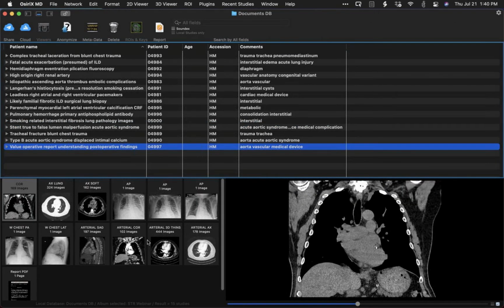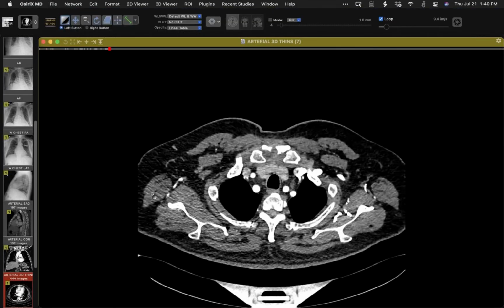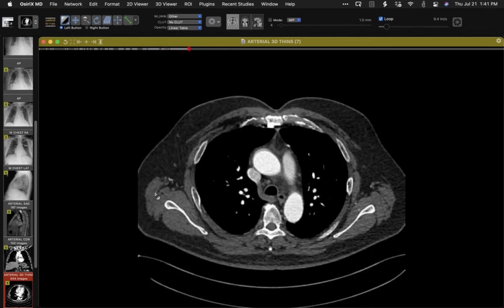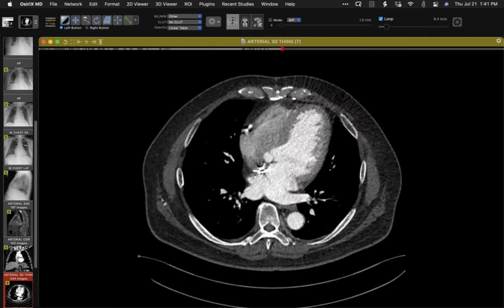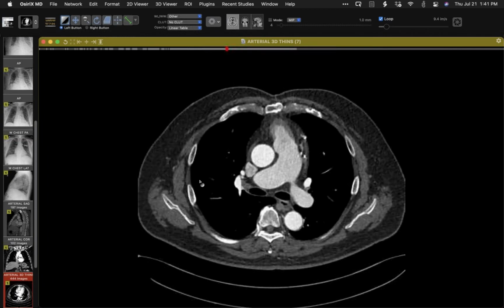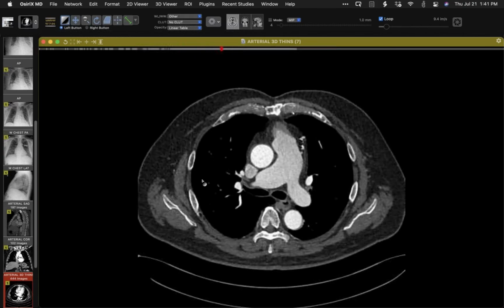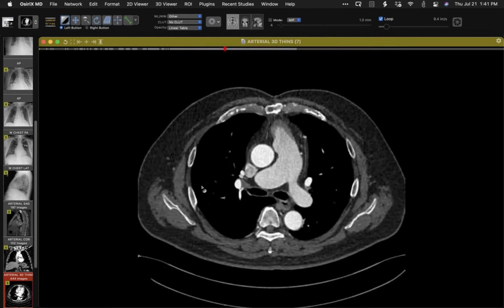This is just kind of the case where if you start off looking at a post-op CT like this, where you have a history of a surgical procedure done, and it's not entirely clear what was done, except that you have a post-op situation where you see a sternotomy and you look at this and it doesn't look like ordinary aortic surgery of any kind.